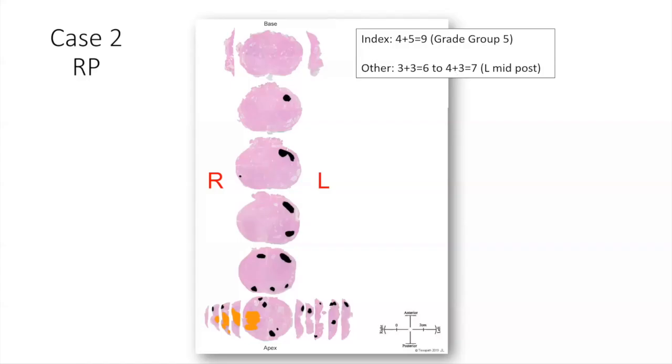So on the strength of that, and certainly no evidence of metastatic disease, he went ahead and had a radical prostatectomy. And Andrew, I think you should have that. Yeah, and that corresponds beautifully. It's down in the right apex and in the lower part of the prostate. These are the axial or transverse sections. Interestingly, you used the term bilobed before, Richard. It does have a bit of a bulge and then a cut in, and that's seen histologically as well.